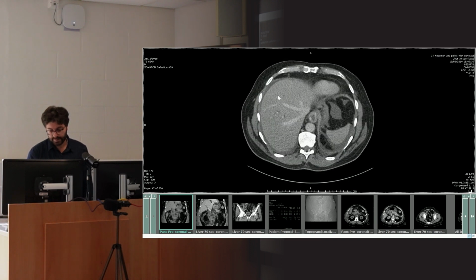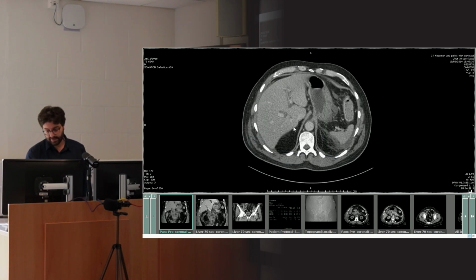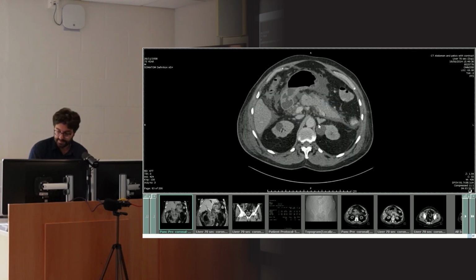So just very quickly, liver is easy. Everyone can recognize the liver. Everyone can recognize the spleen. There's like a mini liver on the other side. Everyone can recognize the kidneys because there's 2 of them and they look kidney shaped. So there we go, this is the kidneys. And usually you can identify the adrenals because they sit on top of the kidneys. You can see them here. They're sort of arrowhead shaped structures.